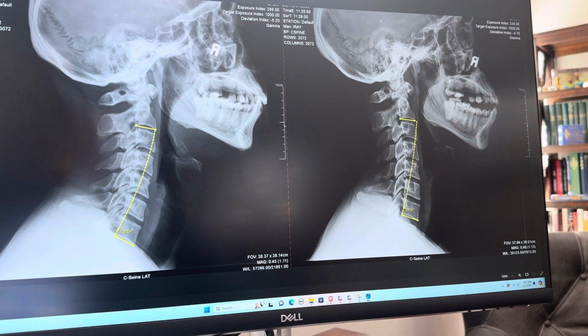You know, take our horizontal hard palate, everything's normal. We come down here, we look at our C2 comparatively, we're normal. This one's a little more straight, a little more upright. This one is starting to get some curvature coming into the back of the neck. We take the bottom of C7 and compare it to the bottom of C7, and overall we've got a pretty darn good structure reconstituting itself.